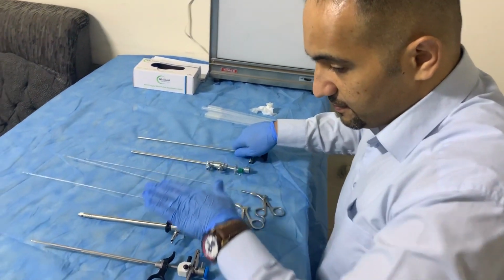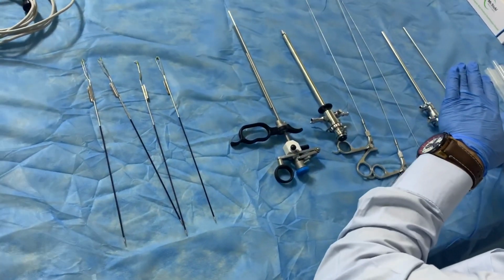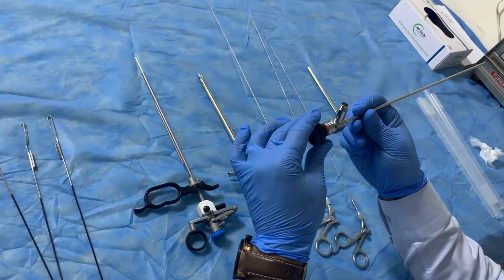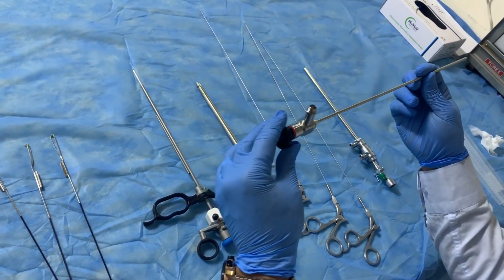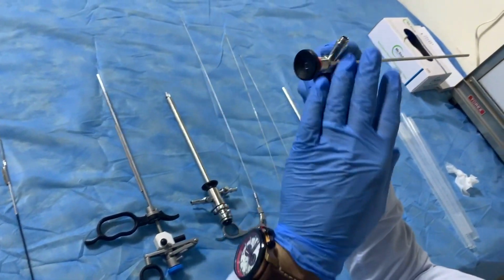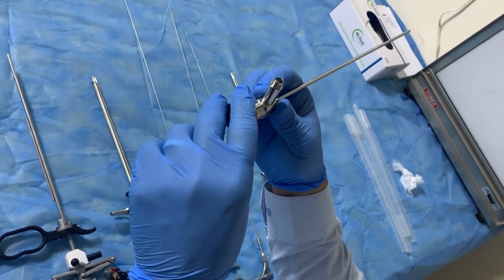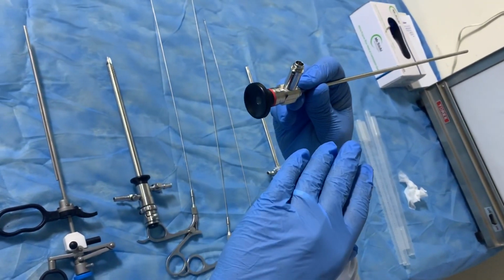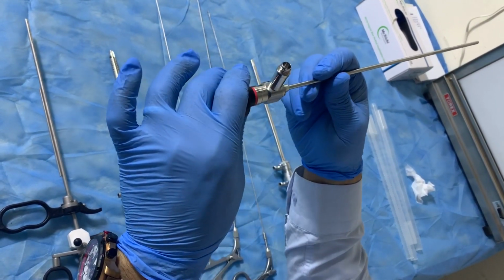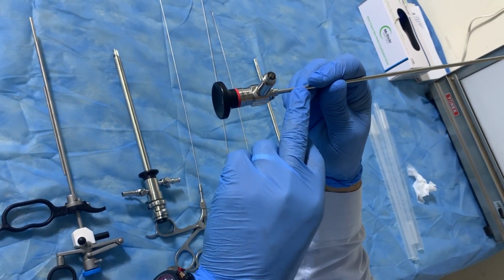This is the hysteroscope instrument. We will start by talking about the telescope. This is the standard hysteroscope telescope. It is 4 mm, similar to the other type of telescope used in laparoscopic surgery. But in laparoscopic surgery, the standard is 10 mm. In hysteroscopy, we use 4 mm. There is also a smaller size than this, which is the versascope. It is 1.8 mm.